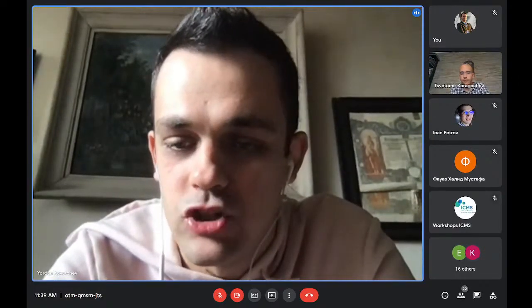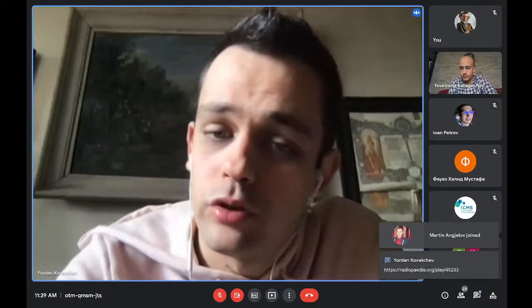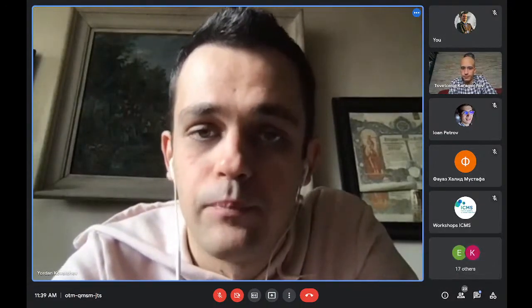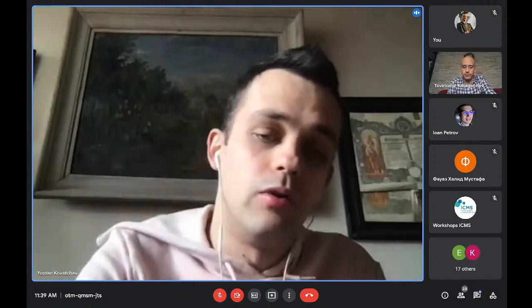I'm sending you a link in the chat now, because this is a workshop after all. You can open it if you want, participate. If you don't, it's fine. You can look at my screen. I'll share my screen now. But look at the last link I sent in the chat here. Just open it, and you will see, you can go along with me as I try to explain to you how I look at every CT.